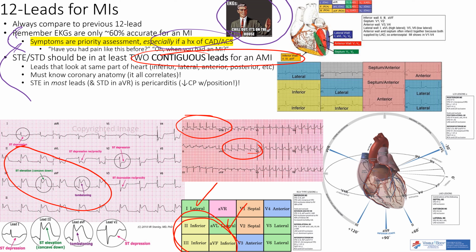I don't know. All right, so anyways, we have ST elevation in most leads. Now that's when we consider it's like, yeah, it's 2 or more. It's all 10. So what? It's all 10. What are you talking about? That's like either they're dying in front of you or they have pericarditis, right? And this is where AVR comes in, because you look, okay, let's look at AVR.